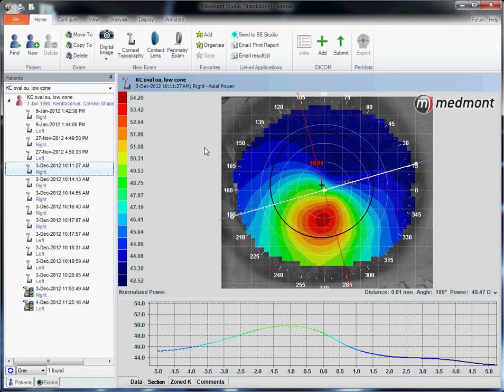This video reviews the contact lens software in your Medmont E300 corneal topographer on diseased and post-surgical eyes. Start by evaluating your initial best topography. In this case, even on this keratoconic patient, we see a good area of coverage, but yet a lot of missing cornea toward the periphery, given that this is a fairly large visible iris diameter patient.